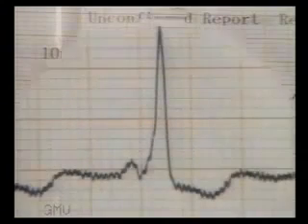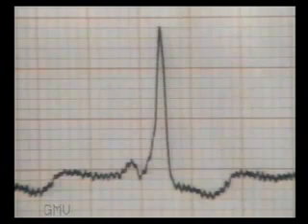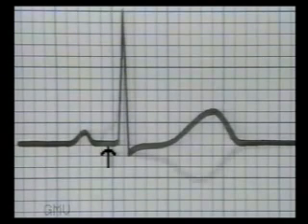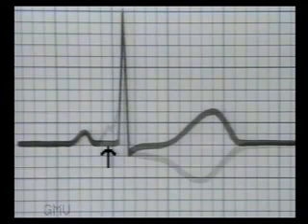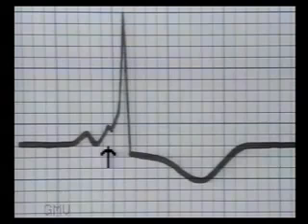It is important to know the presence of WPW syndrome, as it often leads to serious tachyarrhythmias in later life. The isoelectric line between the P wave and QRS complex is due to the AV nodal delay. But in WPW syndrome, the impulse leaks to the ventricles via an accessory bundle of fibers called the bundle of Kent. So the isoelectric line between the P wave and QRS complex is replaced by a slurred upstroke.